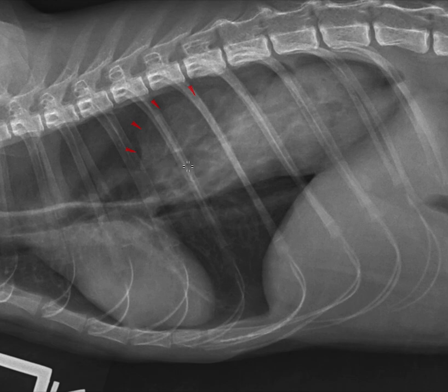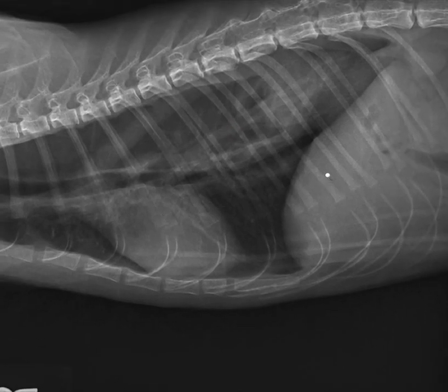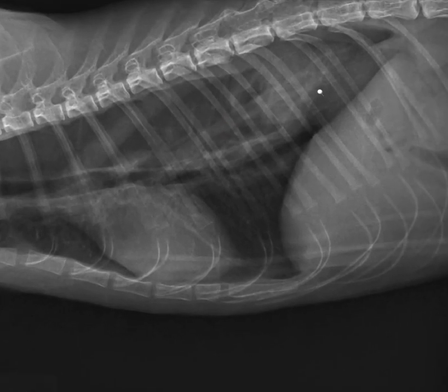The next thing I want to talk about is the shape and the size. So if you look at the size on the left lateral view here, keep that in your mind, and I switch to the right lateral view. The lesion is not as obvious, it's in fact smaller. So this is a lesion that has a dynamic component, is located on the midline and possibly within the mediastinum. It's well margined on its cranial edge, and it has a mixed opacity.